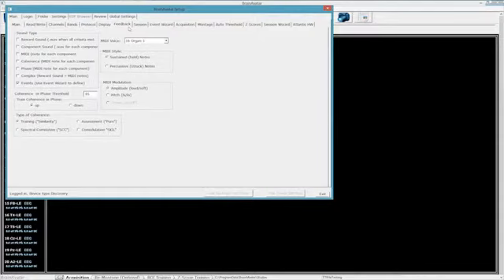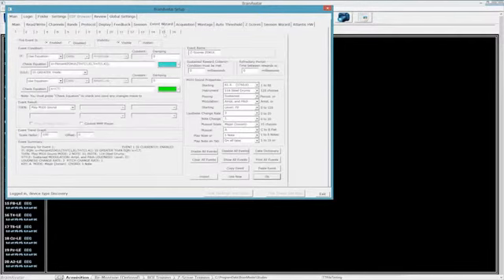And then we got to a point in time where there might be more features that we thought we could do. One of them, of course, that's a very popular one and that most of you out there use, is Z-scores. Z-scores aren't a component like any other thing. It's not just FP1 to LE delta that I'm training. The way we do Z-scores is we're looking at a percentage of Z-scores that are within a range that we've defined. A very complex idea that may not be simple to do with a screen like this, because a lot of things are fluid in motion. So, because we got to a point where we had different things that might be useful for people, we created the Event Wizard.